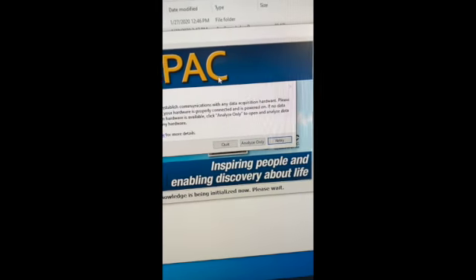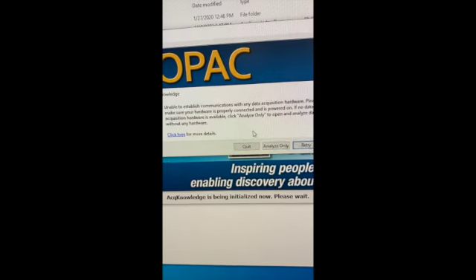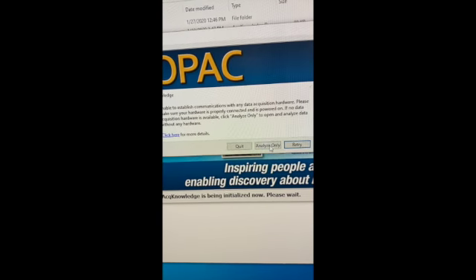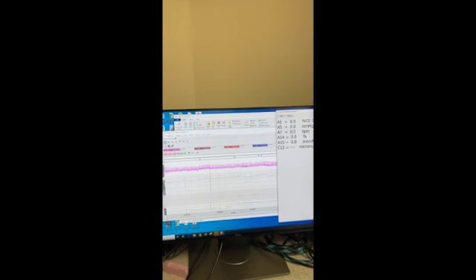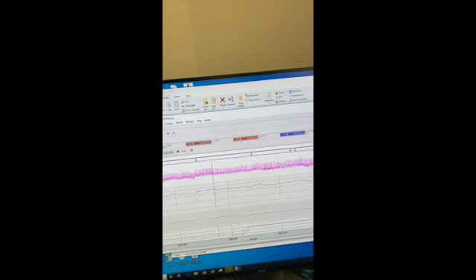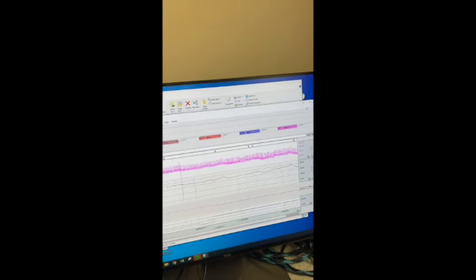When this message appears, it's fine, we're not connected to BioPacks. It doesn't matter because we're just analyzing. So click on Analyze Only and it should pull up. And when it does, then we can exit out of this screen. We don't need it. And you can make this screen here as big as you want it.